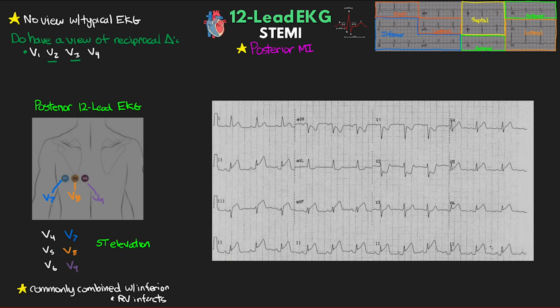So as an example of just this, here's an EKG with high suspicion for a posterior wall MI. You'll note the deep ST depression in V2, as well as depression in V1. It looks like some in V3 as well. Along with that, we also see ST elevation in leads 2, 3, and AVF, with some reciprocal depression in AVL, indicating inferior wall MI, as well as some lateral involvement with elevation in V6, and looks like some in V5 as well. But given the anterior ST depression, especially the magnitude of it in V2, we would definitely want to get a posterior view to check for posterior wall involvement.